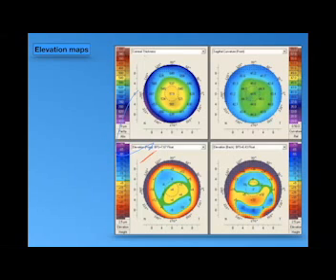Beyond +7, you will suspect. If you find a point more than +12, you have to highly suspect this patient or this anterior elevation. You will put a sign on it: there's abnormal anterior elevation at this point.